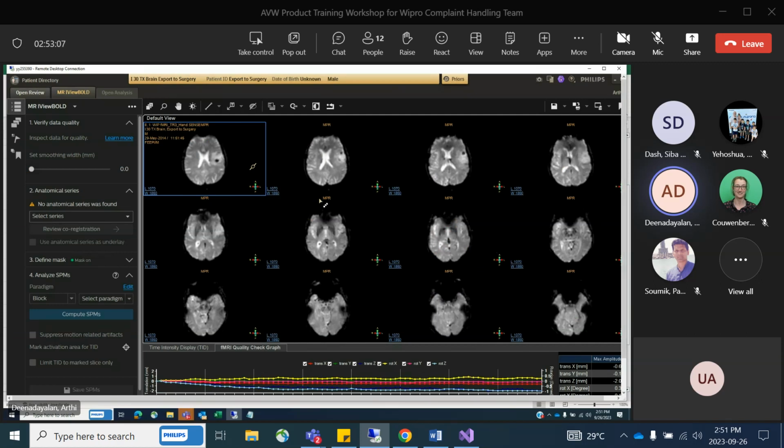This is how the application looks when you load it to the fMRI application. So the basic functionality is, what happens when you do a brain scan, and after doing a brain scan, how do you see the activations when the particular scan is done. So that is what we'll be doing here. I will not explain in depth the clinical process, but I will just tell you the functionality that we perform here. So once the data is loaded, we have to create something called paradigms.